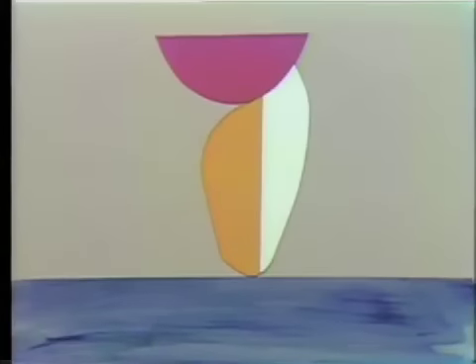An important point to notice in this type of pontic, the Steele's flatback, is the problem of incisal protection. Because this facing slides on and off in this direction, it's not possible to have incisal protection in which the gold is brought over the incisal edge as it is done in the long pin facing. This has to be free to slide on and off in this direction. Incisal protection is gained then by two steps. One is to make sure that the gold backing is left just a little extended here beyond the facing, the porcelain facing.